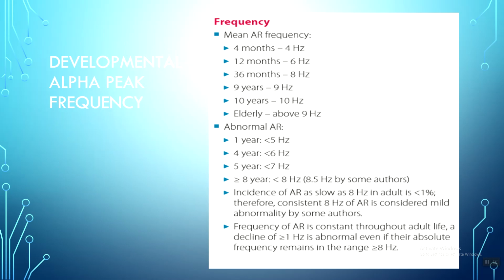Yeah. And this is really important when you get a pediatric case that comes to your clinic. You've got to be able to find their alpha rhythm. Because then you can say, okay, even though the EEG looks crazy, because little kids' EEGs look like little kids' handwriting, it's a ton of theta. The raw EEG is messy because they are a kid and their brains are coming into formation. But their alpha peak, if it's beneath these frequencies, then you have someone that's slower than average.